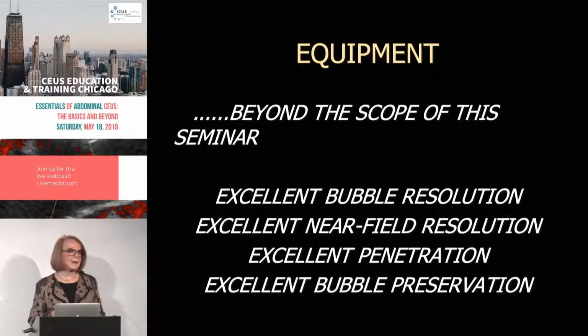And so that company has now really looked after that, and they tell me still, they know I said that in the past, they make a point of telling me that their bubbles are exquisitely resolved now, and that's true. And so we want to have excellent bubble resolution, and we want to have excellent near field resolution. So all of you are aware that oftentimes ultrasound machines, and still today I'll show some cases, we'll have a big bang in the near field. We don't want that big bang in the near field. We want to be able to see the liver capsule perfectly on every case.